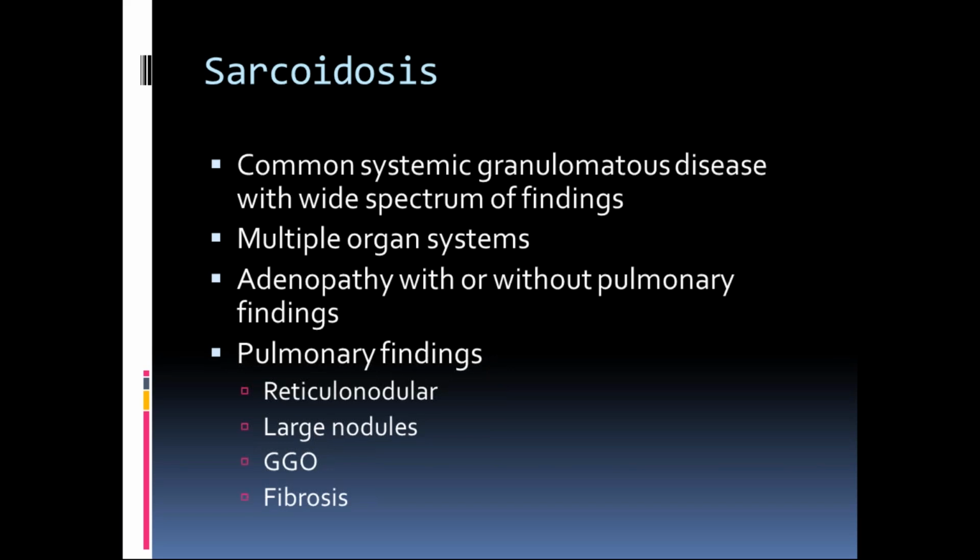And as you know, I'm not saying anything new here, but sarcoid is a common systemic granulomatous disease. But the thing is, I think I have about 6 or 7 different ways that sarcoid can actually pop up. It's a pretty common diagnosis that I make down here in the southeast. So I have lots of cool examples of what it can look like.